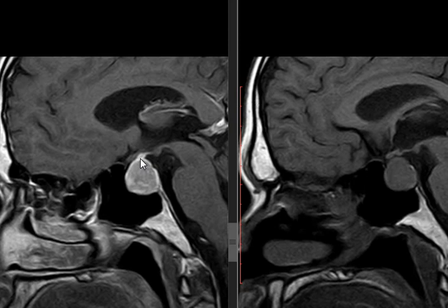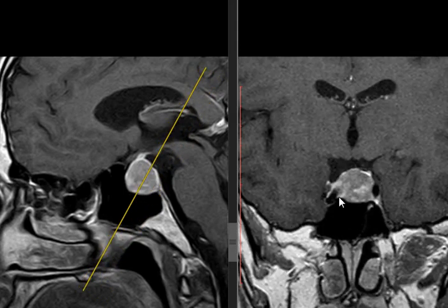Now I'm done. Do you agree, guys? This is the pituitary stalk, and this is a big macroadenoma in the pituitary. Could it be sarcoidosis? You should have basal enhancement and nodularity, something like sarcoidosis or TB. Could it be an aneurysm? First, you don't have signal void. Second, aneurysm of what? These are the internal carotids bilaterally, very nicely demonstrated.